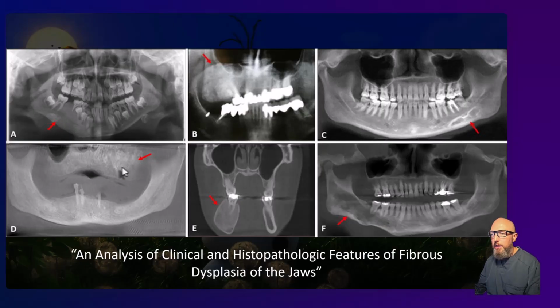As we go down here, this one is a little concerning as a possible osteosarcoma, maybe not as destructive as you might see, but very mixed appearance and ill-defined, filling in the sinus with this fibroosseous tissue. That's another sign of fibrous dysplasia. If you see in the 3D view, I think it's a dead giveaway because then all the bone in here, it just has that granular appearance. And it's expanding. Everything about this to me is shouting fibrous dysplasia.